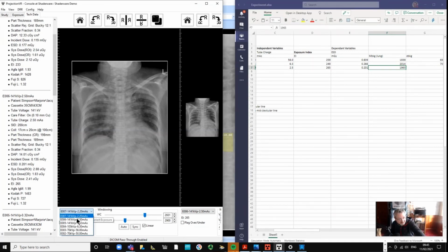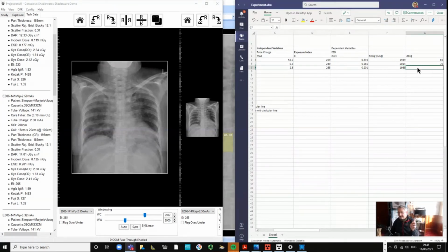But okay, you're right, sorry, I've still got the confused exposure myself. There you go, there's the one we're doing. Perfectly correct, check me. Okay, so the mean background is 1965. You all agree on that? Yeah. Standard deviation background? 68.